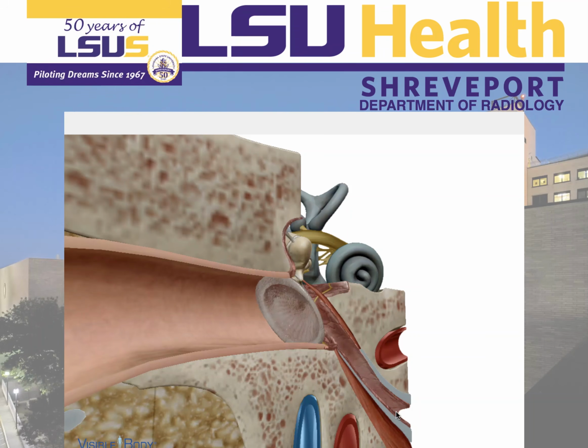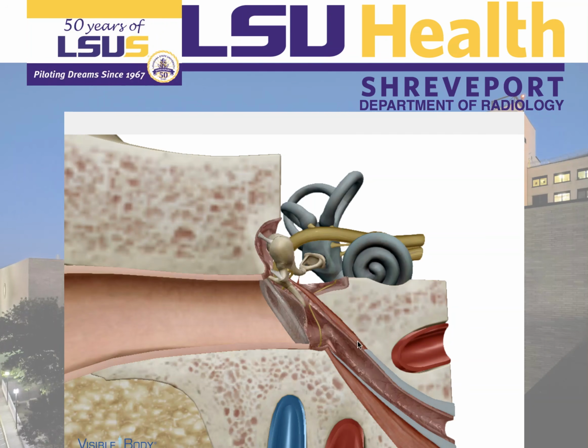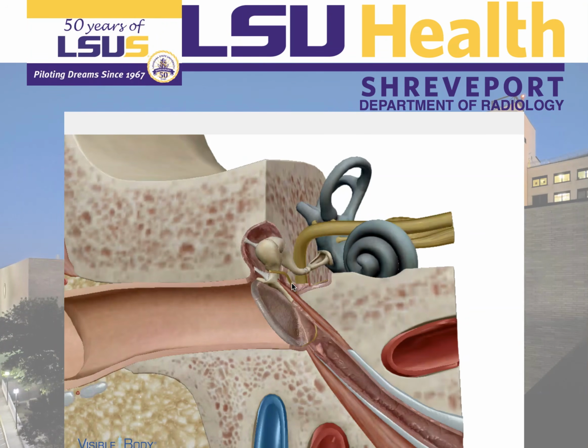Okay? The Eustachian tube shows this muscle that we can see better here. This is the tensor tympani muscle, and it attaches to the malleus here in the intersection between the neck and the handle of the malleus. Okay?